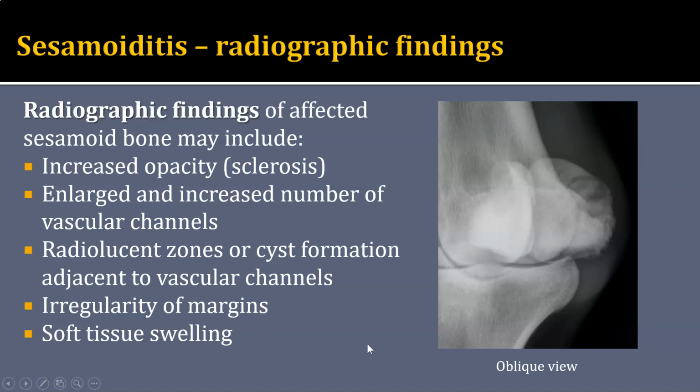And actually what those radiolucent areas reflect is really a region where there isn't that osseous proliferation. So it's not necessarily that they're abnormal, they just look like they're abnormal adjacent to the proliferation. And then certainly we might identify soft tissue changes because of the suspensory ligament being involved. So a lot of times that would be swelling.